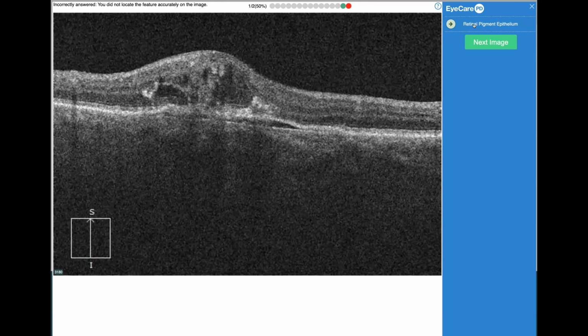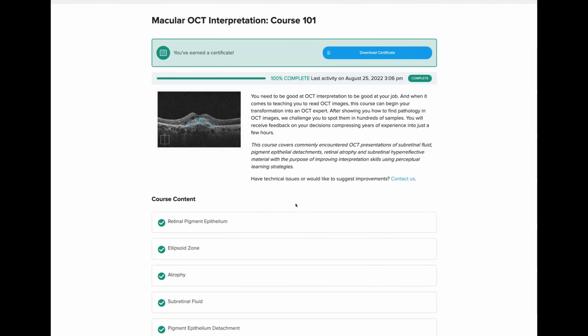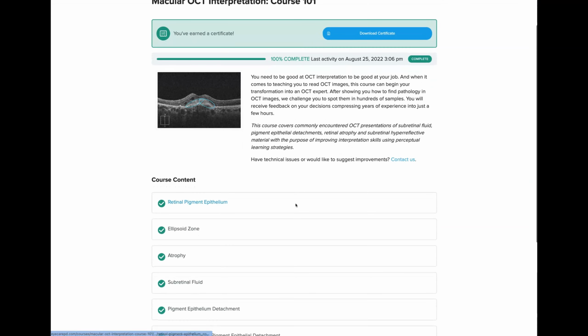It is also a good idea to not just review the easy sections of the images where the answer is more obvious, but look for challenging sections of the image to push your learning forward. Remember to read the rules for each game, as there are different game types and different streak goals in order to mark the lesson as complete. But do not get caught up in making sure you fully complete each lesson. Rather, learn the skills needed, have fun, and move on. As you progress, you will encounter more terms.